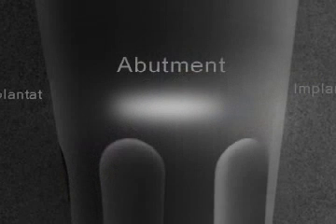Abutment and implants are linked so tightly with conical connections that not even a scanning electron microscope can reveal any spaces or gaps. With plug-in connections, a clearly visible gap can be found. This gap gets occupied by bacteria and bacterial product, because chewing motions cause movement between the implant and abutment. This movement is clearly visible in the special images. There is no movement with conical connections.